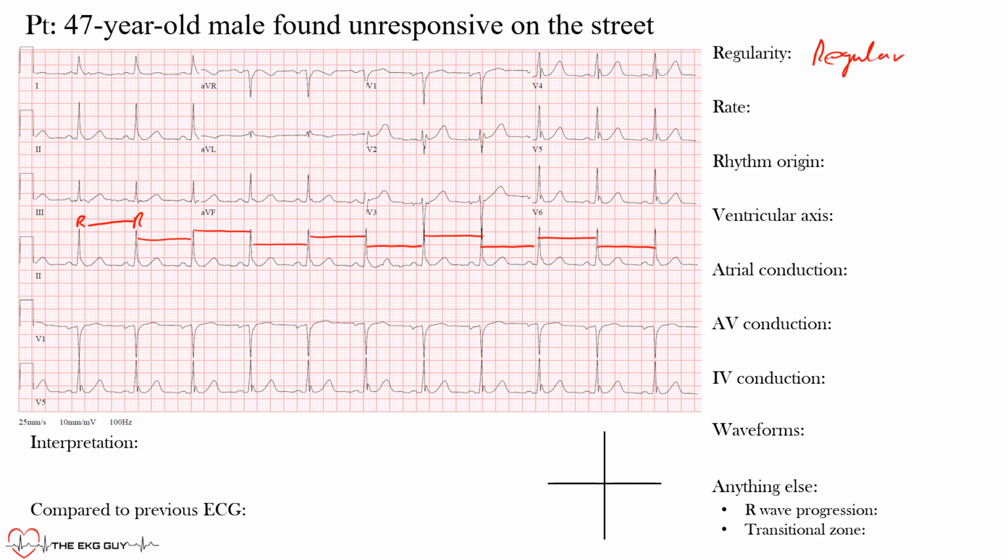Okay. Now, why is that important? Because there are many ways that you can find the rate, okay? But there are only certain ways you could use some of these if it was irregular, okay? So I'm going to show you both ways in this case, and then tell you which one you could use when it's irregular, all right? They're both quite easy, and you may have heard of each of them, okay? We won't go into too much detail on them.